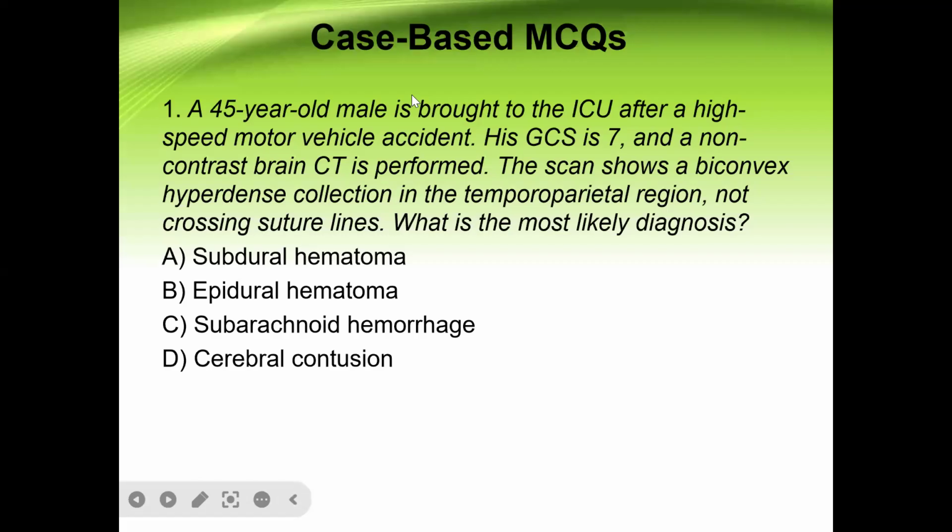Anybody? Epidural hematoma, sir. B, epidural hematoma. Okay, correct. Any reason why you're choosing epidural hematoma? Yes, sir, because of the nature of the presentation, the biconvex hyperdense collection. Okay, correct. There's also the high-speed trauma. Epidural hematoma is correct. Let's go to number 2.